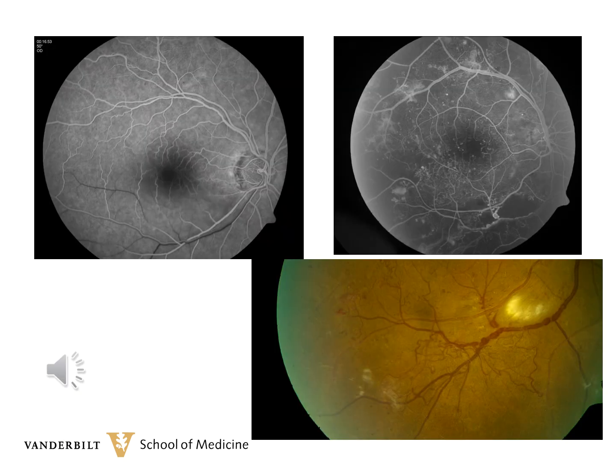At this point, I would like to show you a comparison of the hypofluorescence of the last patient to another patient who has hypofluorescence but from a filling defect. The patient in the upper and lower right side has proliferative diabetic retinopathy and capillary loss.